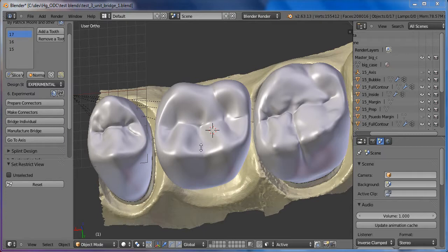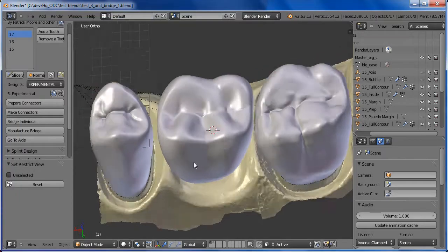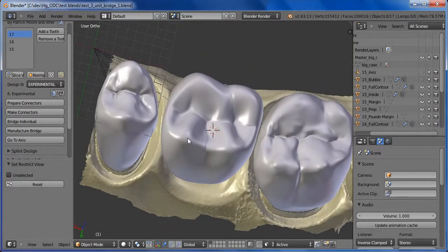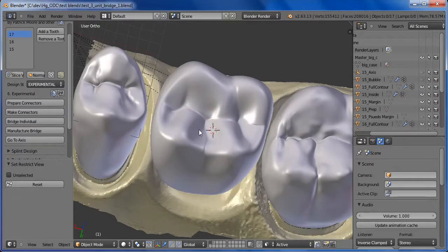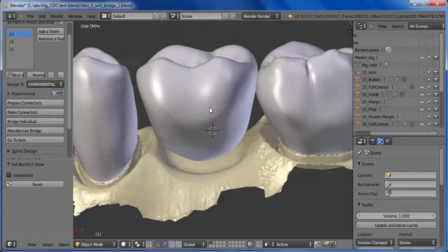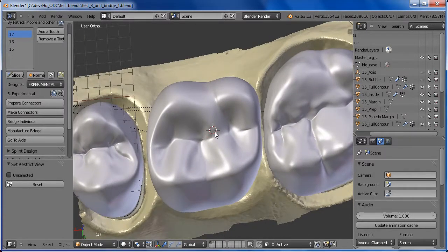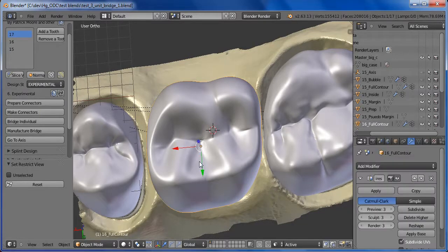Right, one of the problems that we used to have with the bridging functions, actually one of the many problems, is that the Pontic occlusal anatomy, or any sculpted anatomy in this tooth, was destroyed in the act of filling in the bottom here. So to get to any reasonably shaped Pontic on the top or on the bottom, it's an extraordinarily time-consuming ordeal, especially for a full contour bridge. You'd have to sculpt back in all the anatomy.